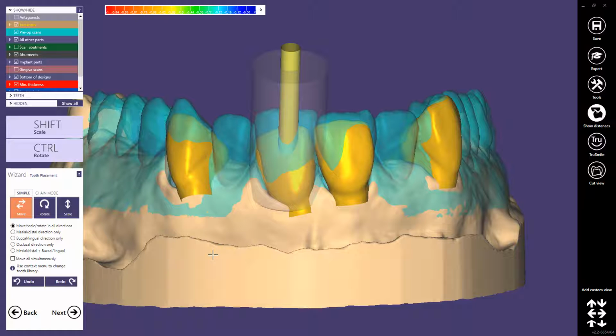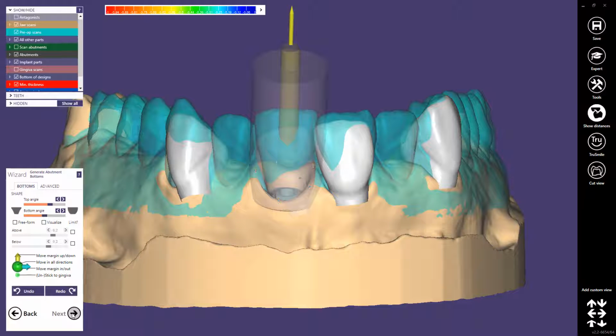For telescopic crowns that's the only job where I don't use any tooth placement, because I did many telescopic crowns in a German lab in the past, and usually you just try to design them as thin as possible, and as long as you are not creating any milled lingual or anatomical parts on your telescopic crowns, you really don't need to do any tooth placement here, and therefore I simply skip this step and don't invest any time here.